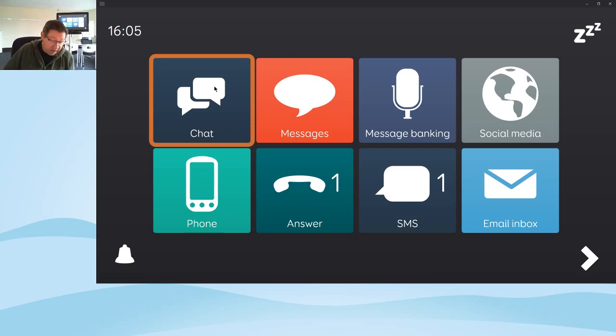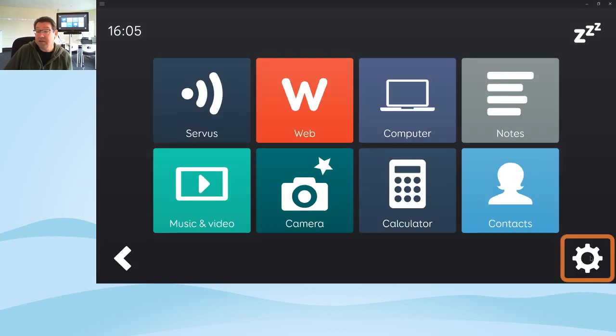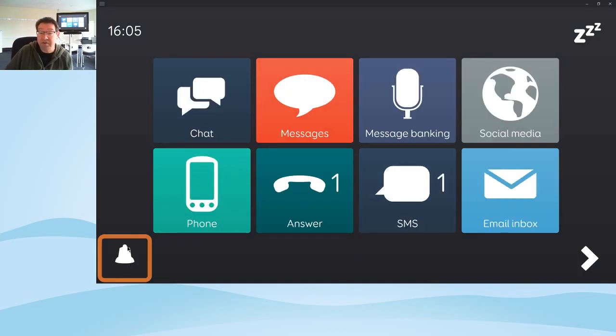So the home grid is designed to be somewhat similar to what you'd find on a standard tablet or a phone, with a home screen for launching apps. And so it's made up of two screens in both versions, and you can see there what cells are available, which gives you an overview of the functions that are available within Fast Talker. I'm going to give you a tour of some of those this afternoon. There won't be time to go into everything, but hopefully we'll give you a good flavour of what's available in there, and then you'll be able to explore the rest for yourselves.